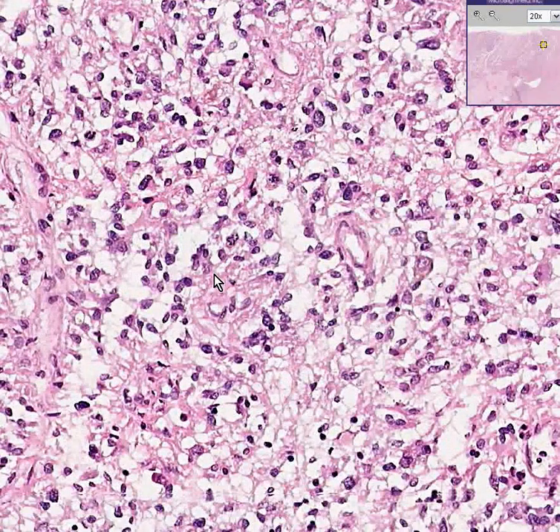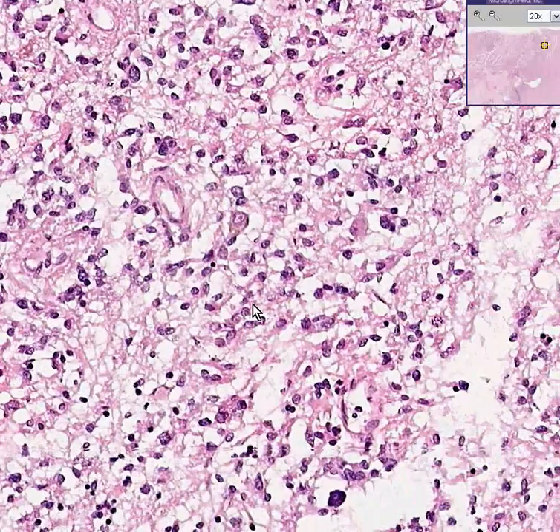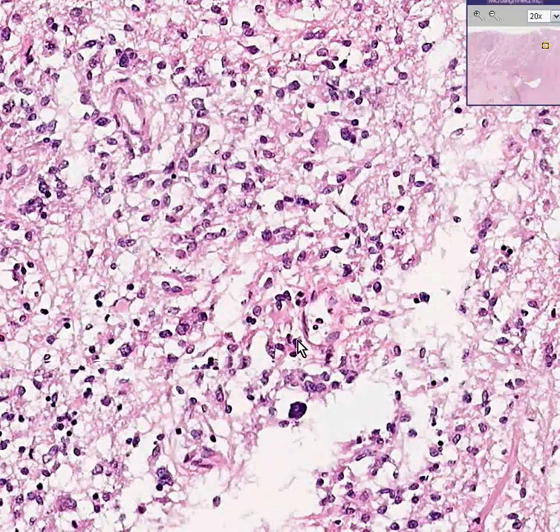Notice even on the small blood vessel level, you can see a palisading of tumor cells around the blood vessel. Oh, here's a real big, dark, ugly cell. Here's some that are pretty nasty. And these are features of glioblastoma multiforme: extreme pleomorphism and hyperchromasia. But the main feature is that you've got to have necrosis.